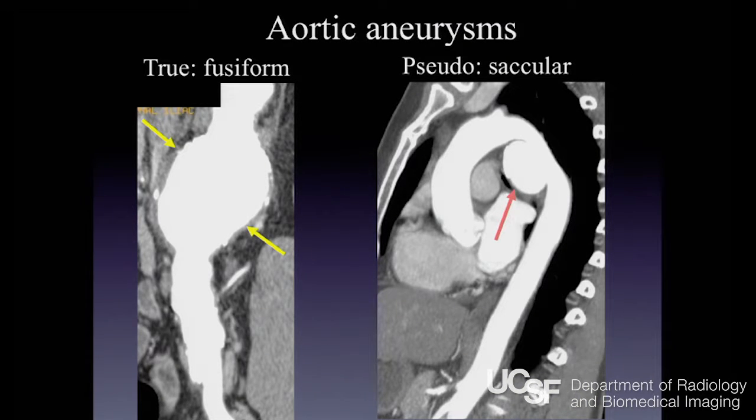Karen talked about the appearance of aneurysms versus pseudoaneurysms in the heart. And there's a few differences between the heart and the aorta. In the aorta, it's predominantly about shape, right? Fusiform aneurysms are usually true aneurysms. They don't really have a neck on them. They're just a focal dilation, whereas pseudoaneurysms are saccular. Whereas in the heart, it often involves the neck itself and the location, not so much the shape. So that's an important point to start with: true aneurysms are fusiform, pseudoaneurysms are saccular.